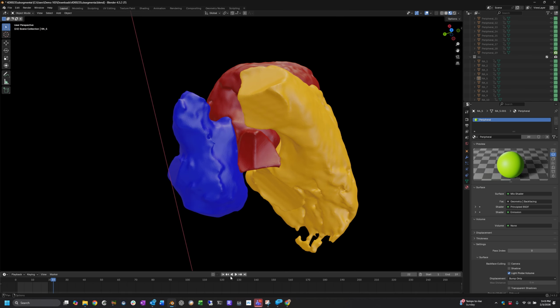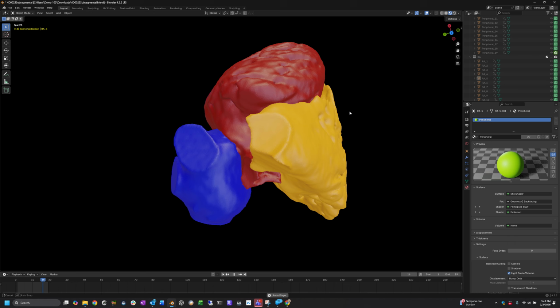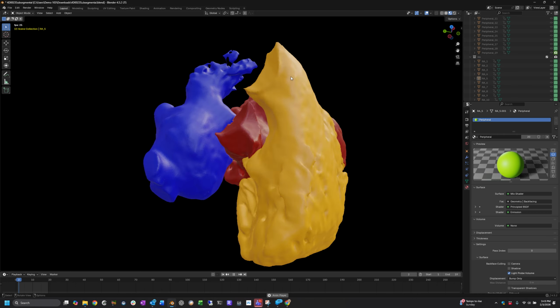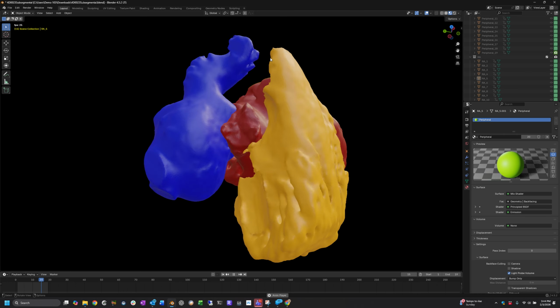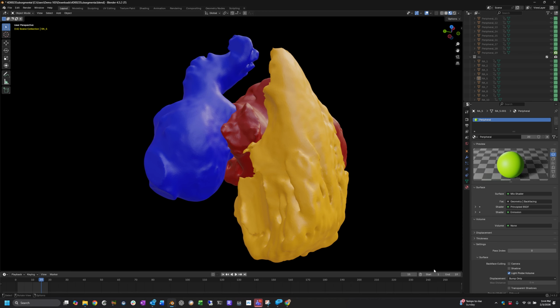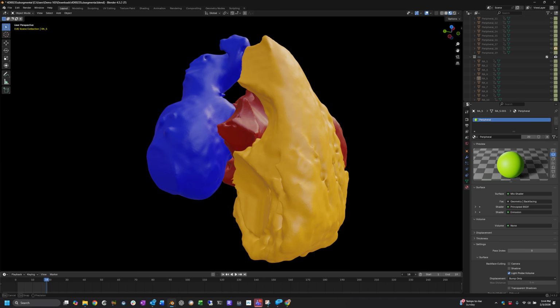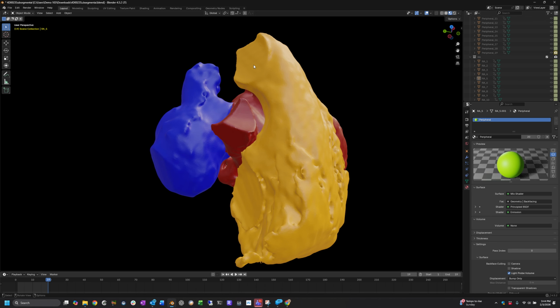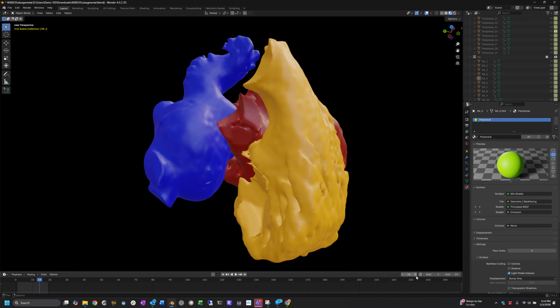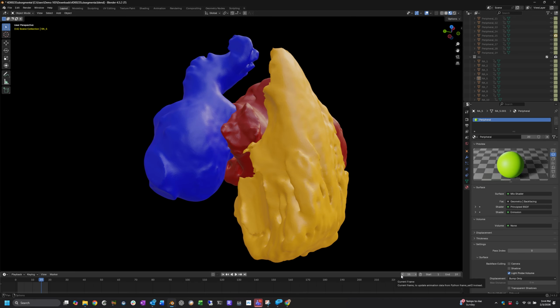And if we look at the pulmonary artery, I think it actually looks better overall than the aorta. And I think probably the only difference is angle. Like that looks a little steep right there. This one, obviously, that one's a little wonky.